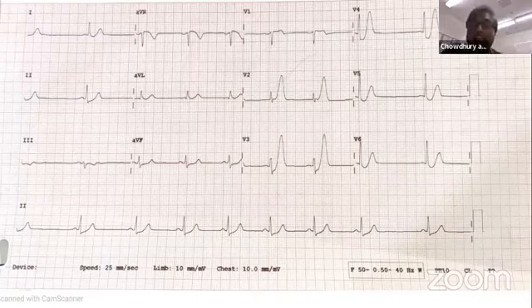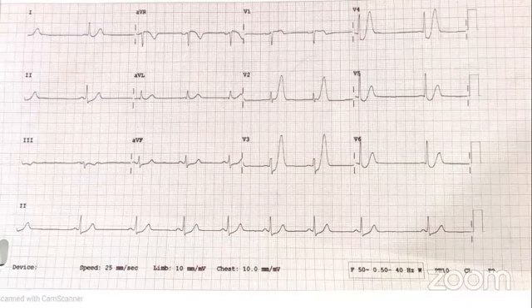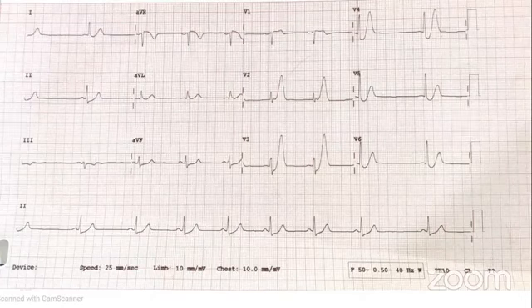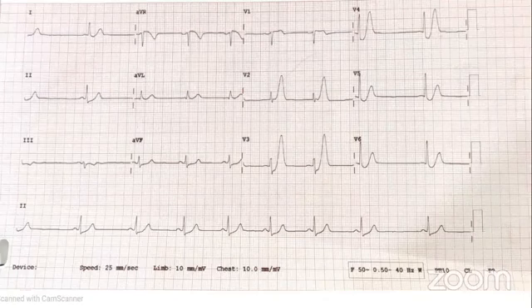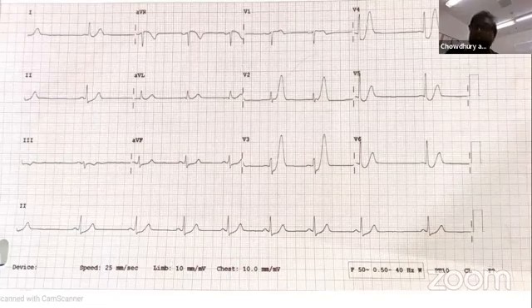Excellent. So can you give me that EKG? Excellent. Beautiful. Just before this lecture, we had a lecture earlier where this was discussed, and this is so practical that we get this ECG just before the presentation. So let me be your student.